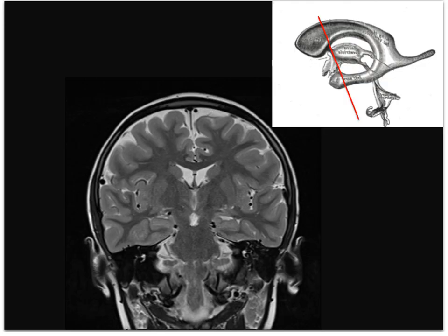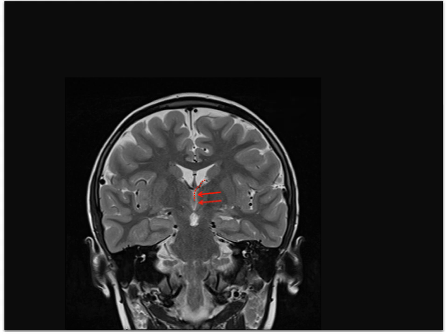Moving back, we have a coronal plane through the foramen of Monroe. This is a connection between the lateral ventricle on each side with the midline third ventricle. A blood vessel here, shown in dark, is the thalamostriate vein and is a dependable vascular landmark for the foramen of Monroe. And these arrows mark out the midline third ventricle into which the foramen of Monroe drains the lateral ventricles.